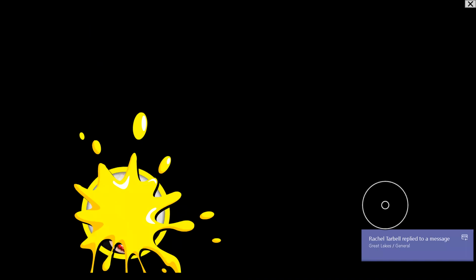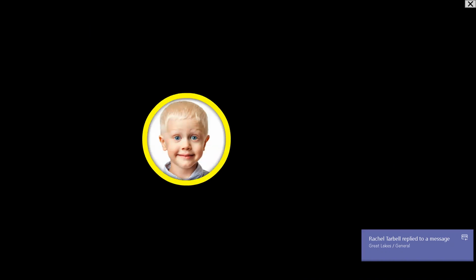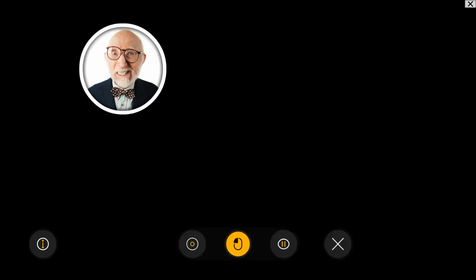If I don't like that I have this circular target, I can actually turn that off. So I can have the user look down and turn off the target. So now you can't see it. Or again, to bring up that menu, you can use your finger or a mouse to click about here, in the bottom quarter of the screen, and click and drag down. It will bring that menu up where I can turn that target off and on right here. And then I'm good to go.